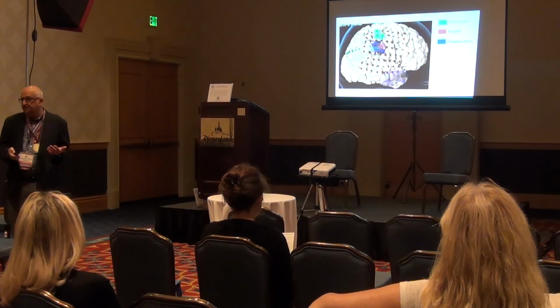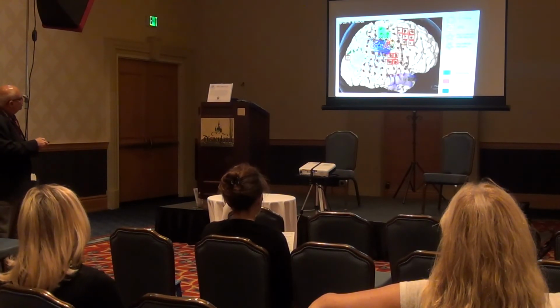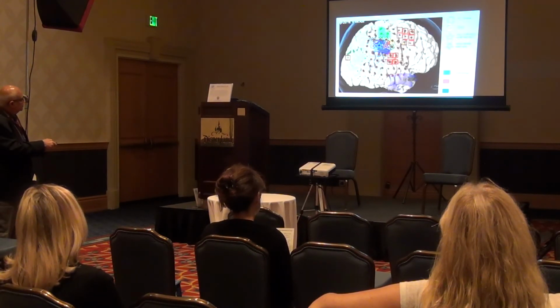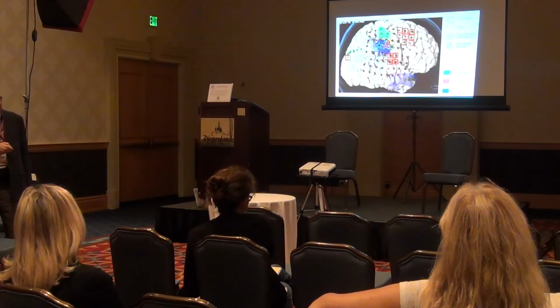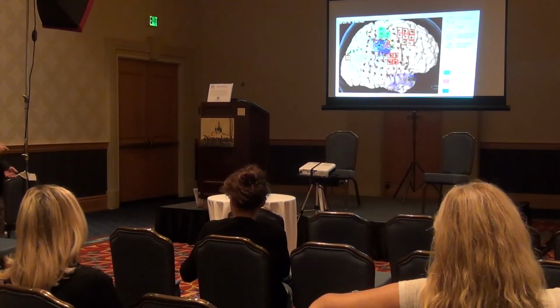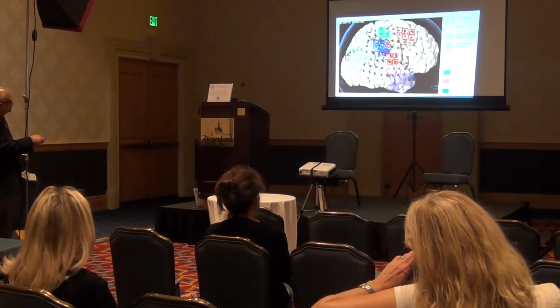And we need to decide what the surgery is going to be. And then here's a very complex thing where we mark focal slowing, now that you know that language, right? We show focal things, then we show spikes. Notice sometimes the spikes are very far from where we think the action is, right? That's why just looking at spikes of the scalp is not enough for surgery. We see spikes. We again have that left-hand motor mark. This is the PET area. But see, here are actual seizures, the stars.